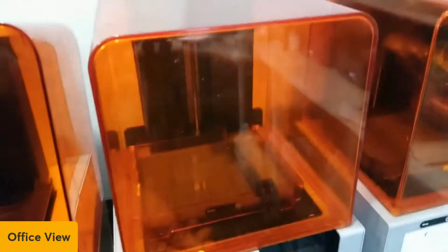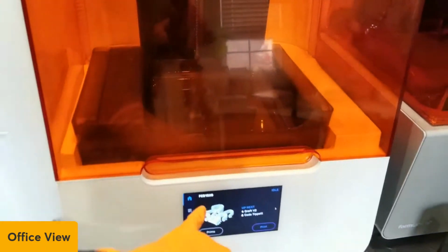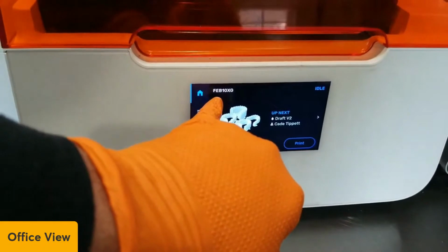Speaking of printing, I forgot to turn this on. So it has uploaded. I double checked that it has my name.